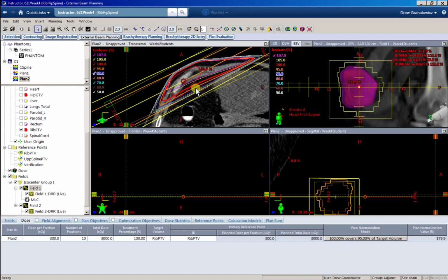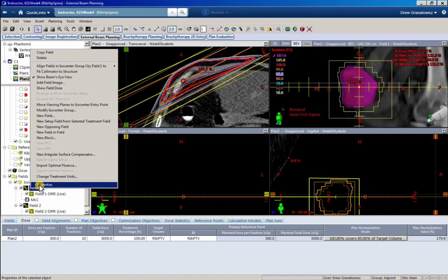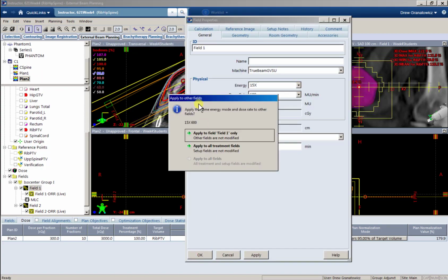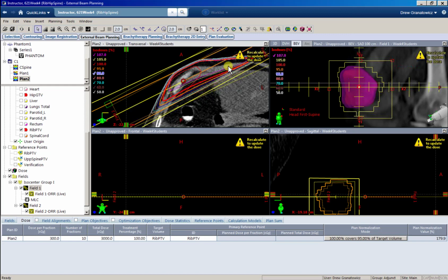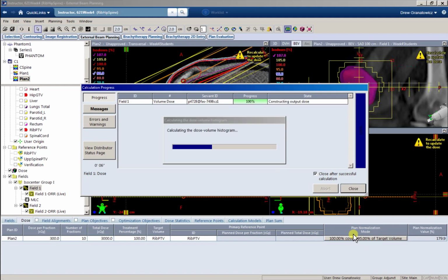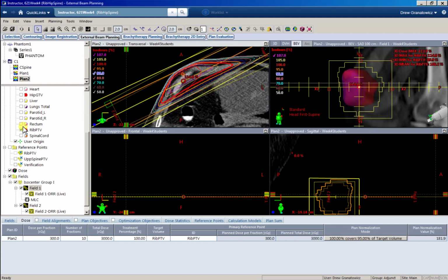Again, it's just because it takes a lot more MU, a lot more monitor units to deliver the same amount of dose deep to this deep part of the target. Whereas if we do use that higher energy beam, it's more penetrative, takes less MU to get dose deep, so therefore our overall plan starts out a lot cooler with that same exact amount of coverage.